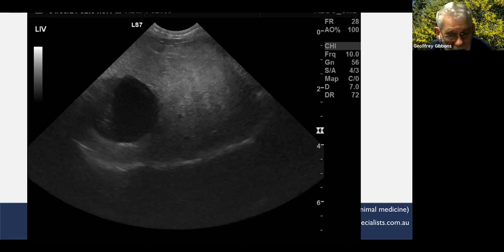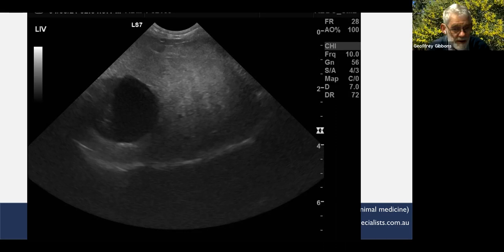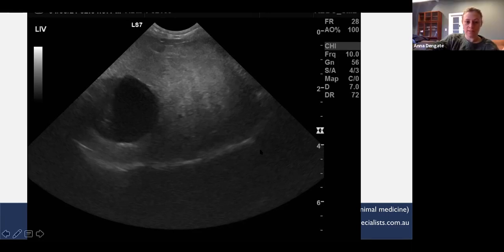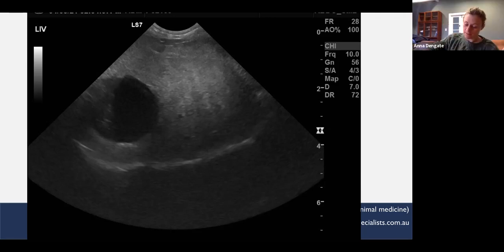Well, the echogenicity and the echo texture are both mixed. Mm-hmm. The gallbladder is quite large. The wall looks okay, but the liver capsule is more hyperechoic than usual. Are you thinking this distal part of the image? Yes, yeah. Good, okay. No, I wouldn't call it nodular necessarily, but yeah, very mixed echogenicity. Good, excellent.